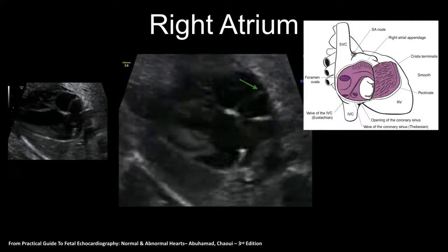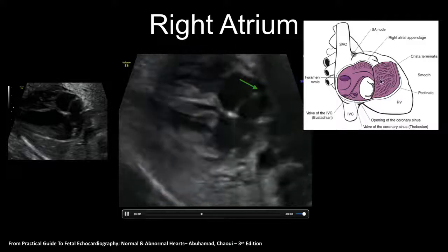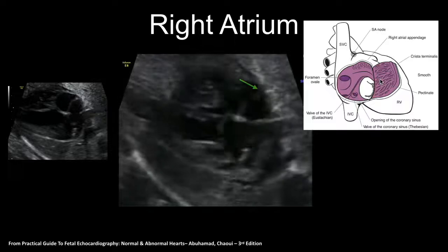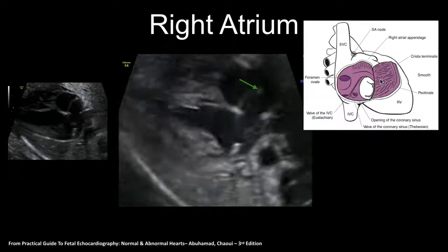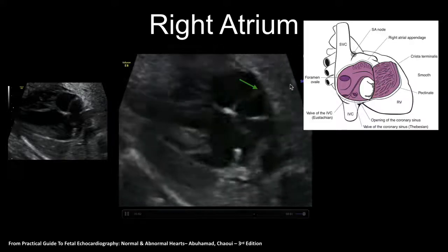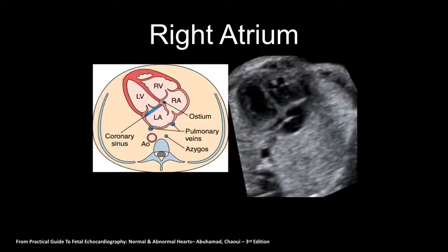So the crista terminalis is that structure in the heart that plays an important role in directing blood flow coming from the IVC with the oxygenated versus deoxygenated blood. This is where, in the rare occasion that we saw this, I wanted to share with you that the right atrium here, where you see that structure inside. And this is it on still image.